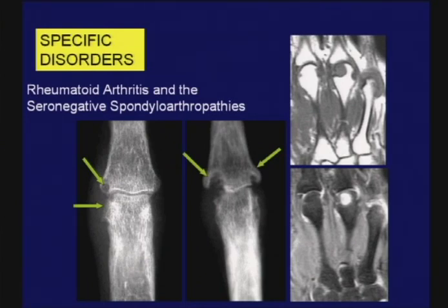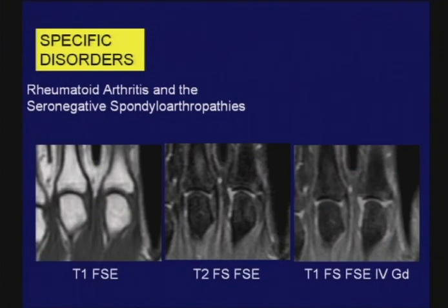But I would caution you that, as I mentioned yesterday, telling marginal erosions of the metacarpal heads, even the phalanges, the metatarsal heads, is difficult because of the normal flattened areas and depressions that occur on those structures. In this case, there's no question we're dealing with large erosions of bone.